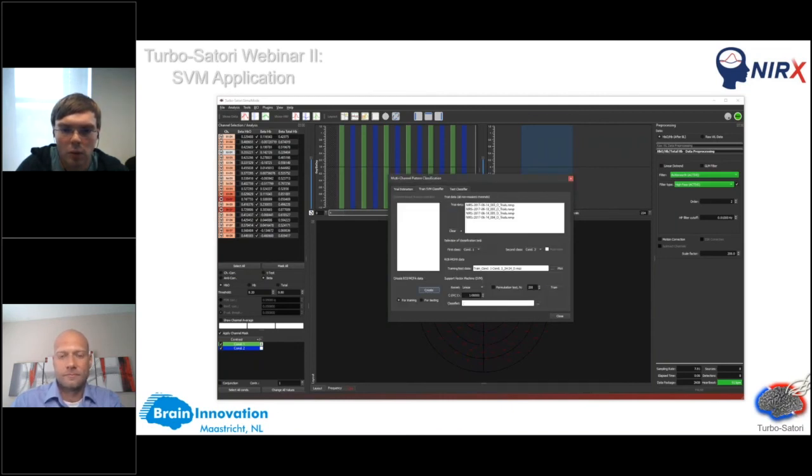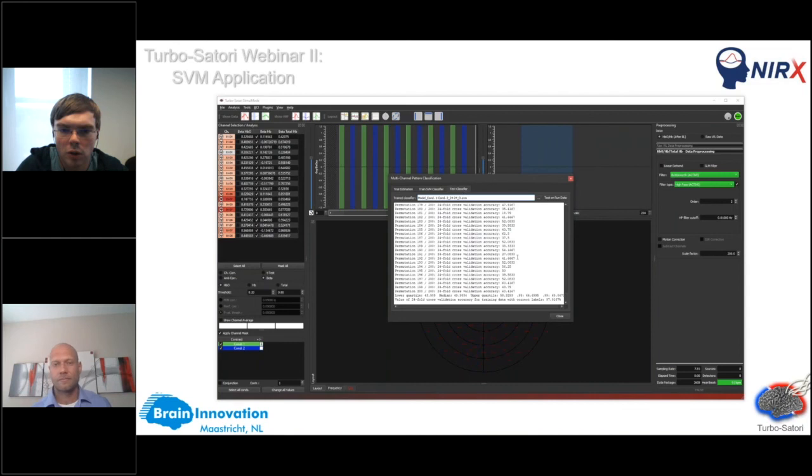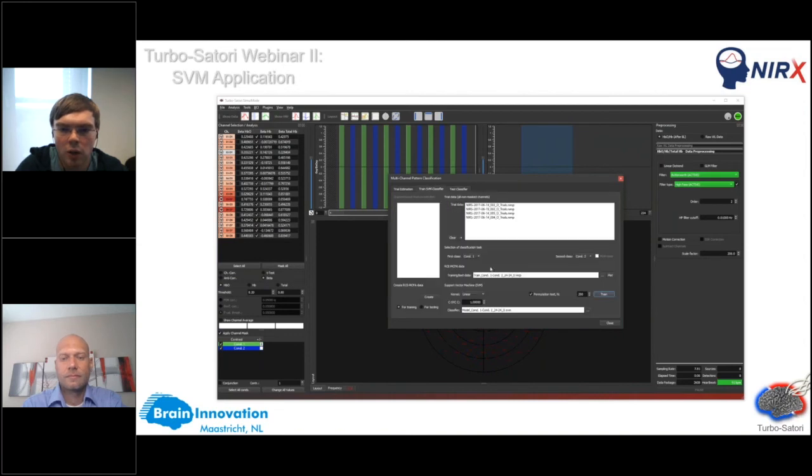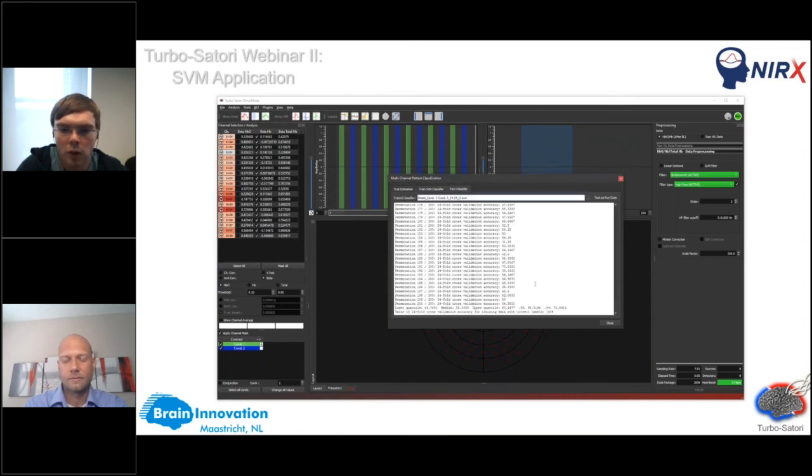Okay, go create. And now you can use the training and the permutation test to check how your cross-validation would look like. And you can now change the C value to a different number. So yeah, if you want to set it to 20, for example, just train it again. And then you would basically get the results for this specific value with the C value.